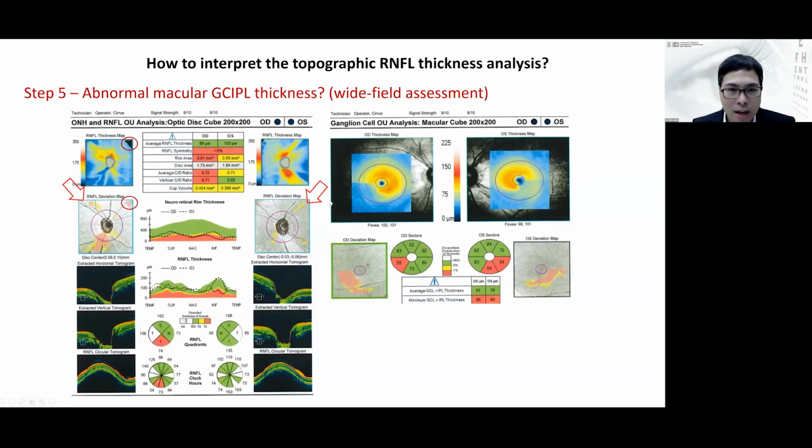So I hope I can point out the abnormal areas for you here, not only limited to the inferior side, but you can also see some abnormal area here. The upper right corner over here, the temple, the nasal side, is an artifact because this is a signal void region. But the arrows over here and here are genuine retinal nerve fiber defects.